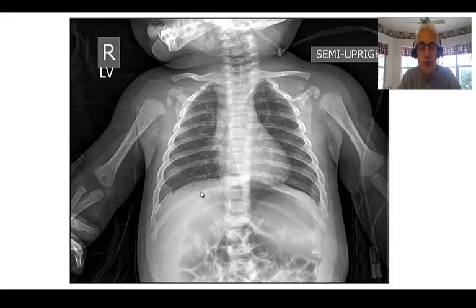The patient is somewhat hyperinflated from all the tachypnea. There's no effusions, no free air. There's some air in the gastric bubble and lots of air swallowing. Look at the whole intestines filled with air from this poor kid doing all the fast breathing he's been doing. Interstitium looks okay. You still see some thymus. Notice a little widening of the mediastinum.